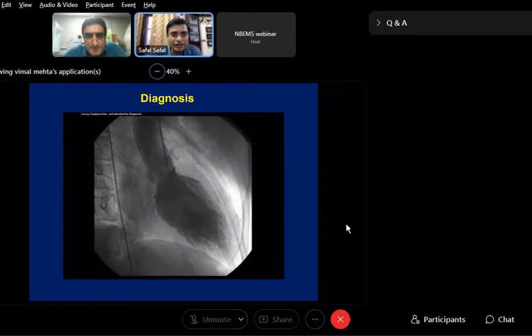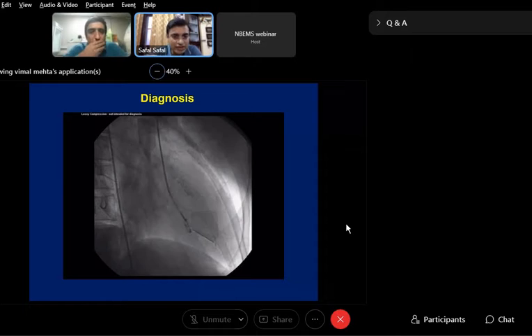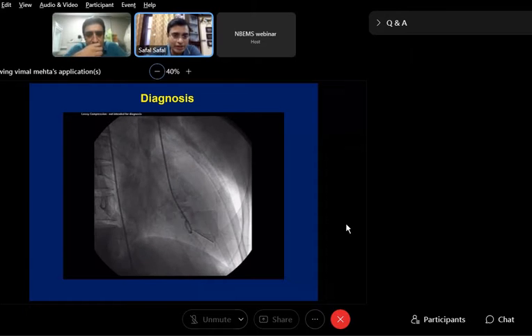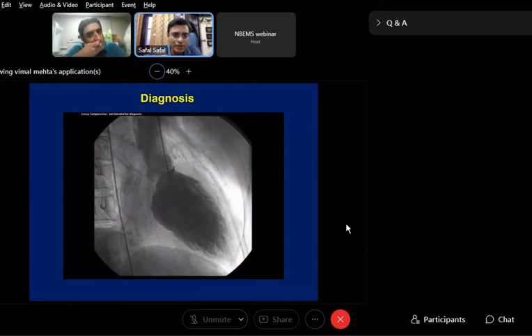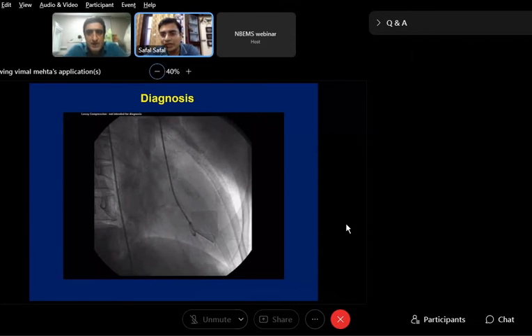A lot of that AR, that's now become one of the commonest things where we are looking for AR on angio. When your wire is across, do not rely on the central AR that you are getting on your angiogram. And obviously for AR, you will be giving your shot in the aortic root and preferably a little away from the valve. So good mistake that you made. We can all get a learning point from that. Whoever has made that mistake.